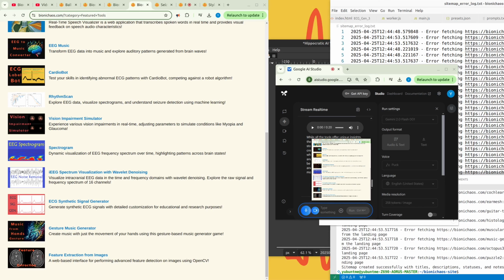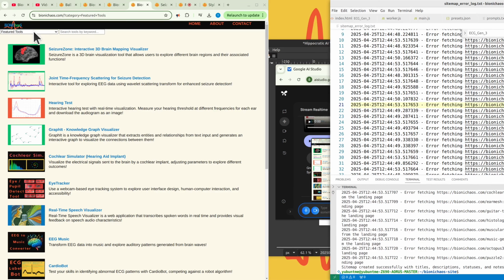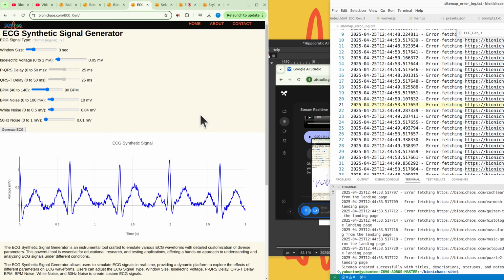We actually have like 3 versions of it already. Just from the drop-down menu, let's select the Cardiovascular ECG. No, sorry. So we have two versions. That's fine. Yeah. So can you describe what you see quickly and what's missing? If you see anything grayed out, tell me about it.